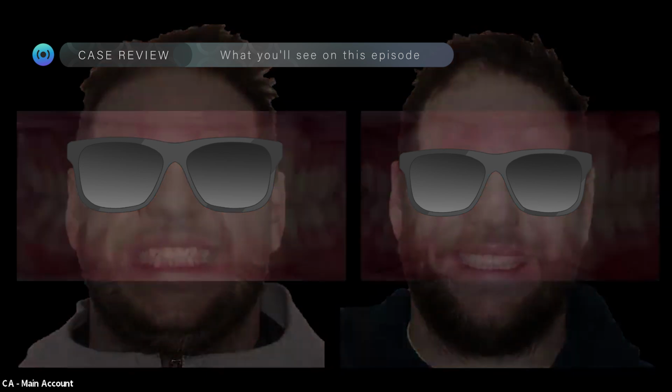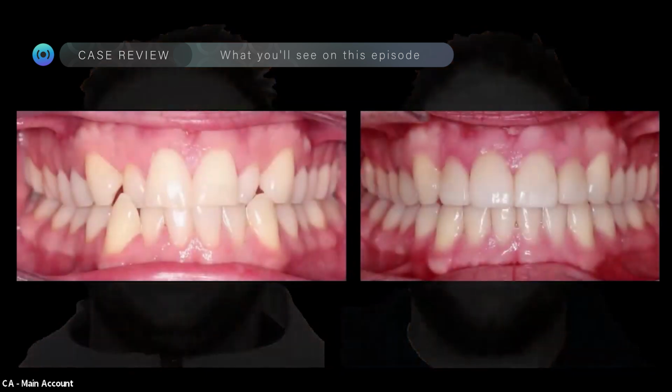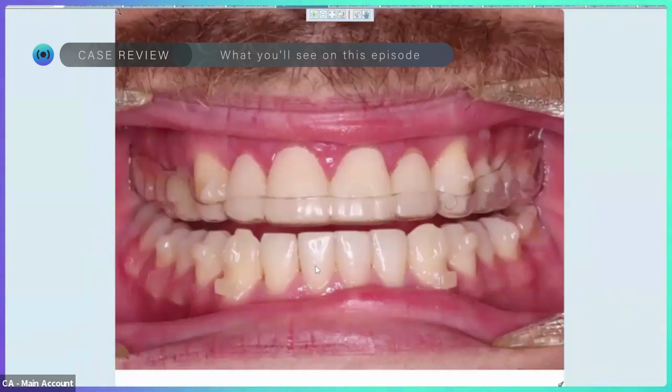You can see that this patient starts off with crowded anterior teeth with a crossbite, finishes with a nice final position. We did do some veneers, so we set this case up for a pre-restorative case. And I'll show you something here. This is really valuable to know.